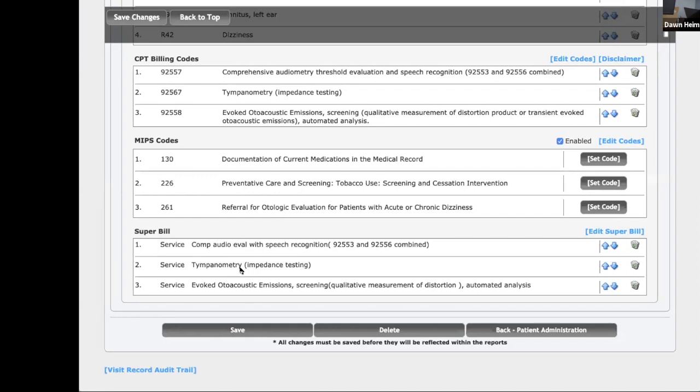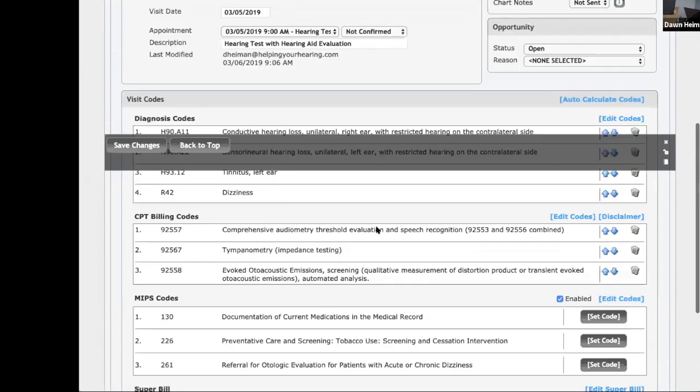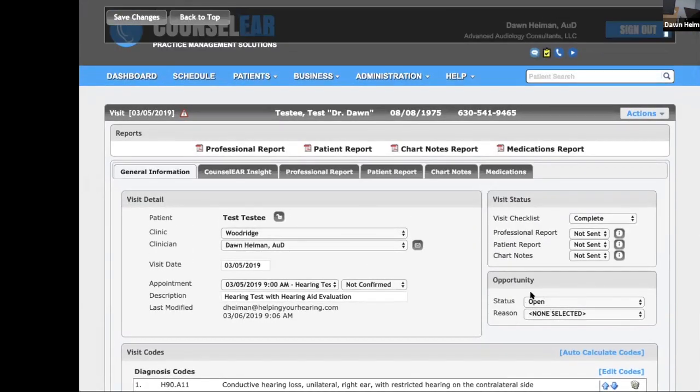Let's say I say, oh no, I did reflexes. Remember, they were absent, and for some reason it didn't do that. I need to go back in, correct that, come back, and make sure I get credit, because this would be temp and reflexes, and make a whole extra $15 if I'm lucky, right? Okay, so now I'm still leaving this right now.